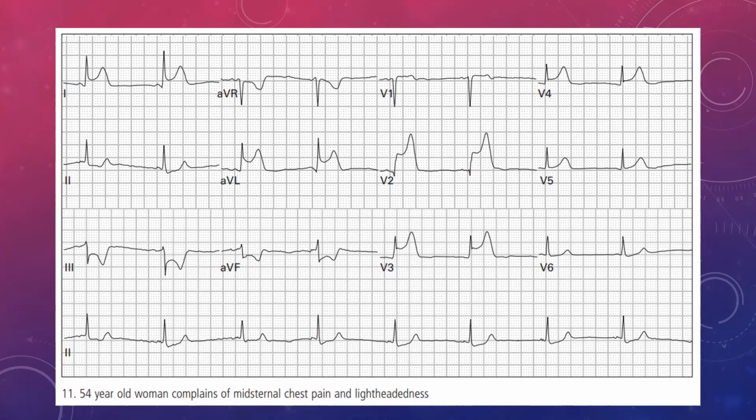So I always like to start with the ECG axis and we look at lead 1 and lead AVF. So lead 1 is positive, and whichever system you use, whichever way you like to think about it.